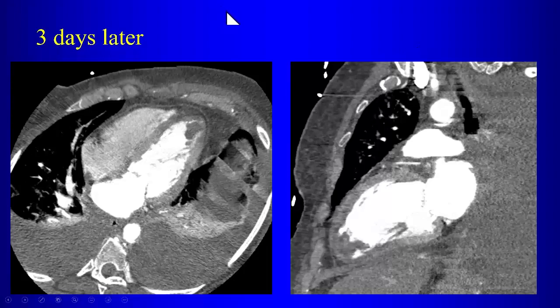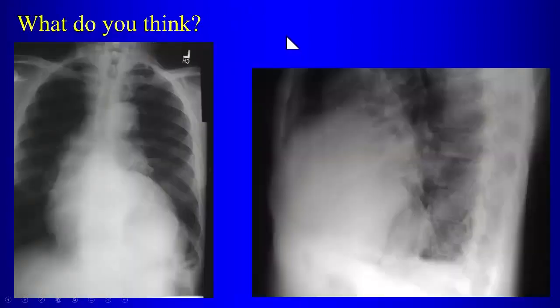So that's thrombus, which is again a complication. So this patient has developed this aneurysm here in the ventricle, and because of the limited wall motion, you get stasis of blood, and the patient has developed a thrombus there in the apex of the ventricle, okay?